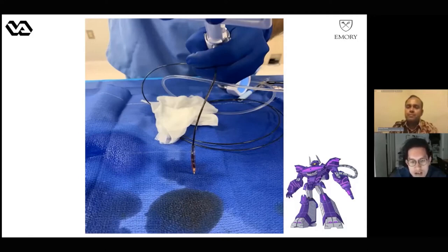So some of my colleagues go up to less pressure, maybe; they will recommend you go up to 4 atmospheres. Some of my colleagues go up to just 2 for the initial 4 runs and go up higher to 4 in the second half of the inflation.